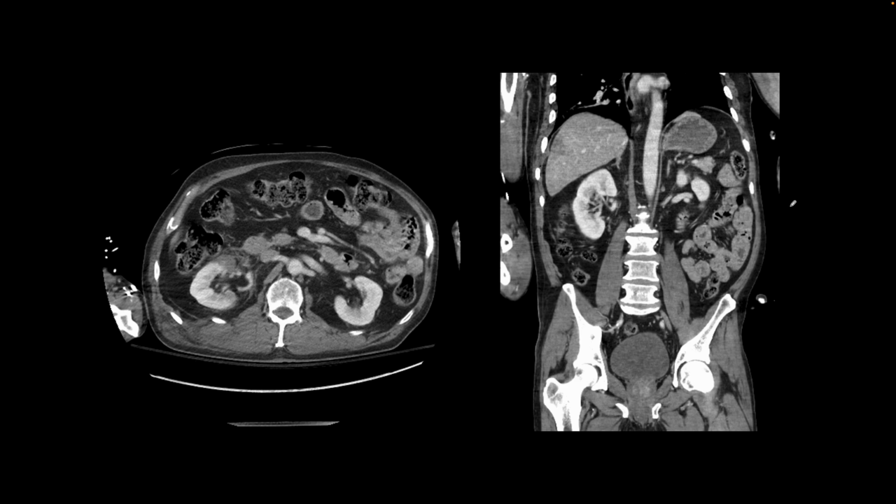This is our next patient. They presented after trauma. We acquired a CT of the abdomen and pelvis, and the findings here are this subtle focus of hypoenhancement in the liver, and also a subtle focus of hypoenhancement with some surrounding fat stranding seen in the anterior aspect of the right kidney. And so these findings suggest subtle contusions involving these solid organs, and sometimes there may be overlying rib fractures in this region as well.